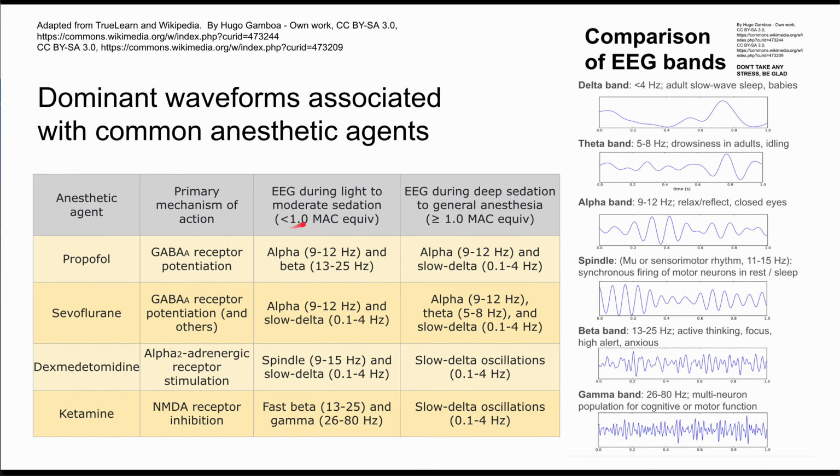So during light to moderate sedation, you'll see beta and gamma waves, and only in really, really deeper sedation with ketamine do you get rid of that high frequency beta band and see that slow delta band.